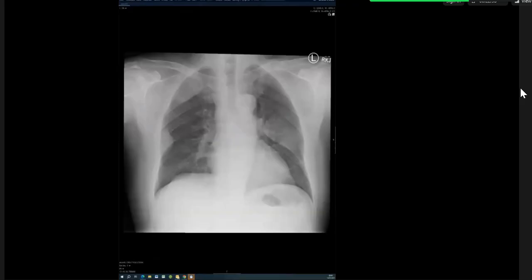Okay, have a go. I am presented with a frontal radiograph of the chest. There are bilateral opacities with their large margin towards the pleura, particularly in the right upper and lower zone. They have obtuse margins with the pleural edge.